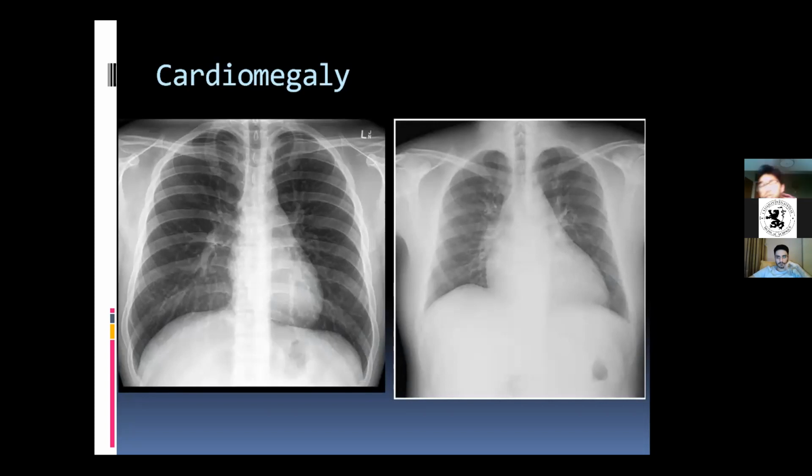The reason for that is because when you're firing the X-rays towards the subject on a PA, the heart is closer towards the detector. So the deflection of the X-rays on either side of the heart won't be as much, and you'll get the true size of the actual heart itself. You mentioned this before, it's a cardiac index, known as the cardiothoracic ratio. We measure two different things: the maximum horizontal width of the heart, divided by the maximum thoracic width.